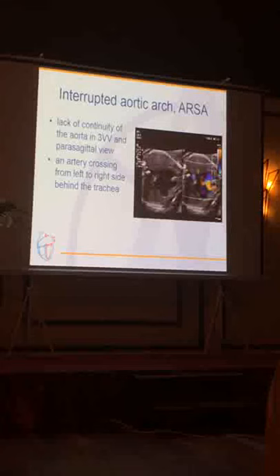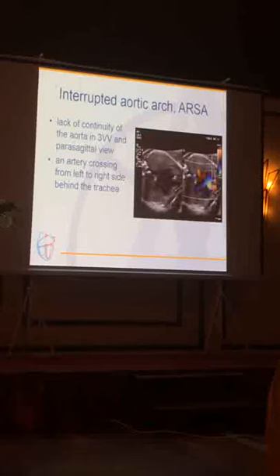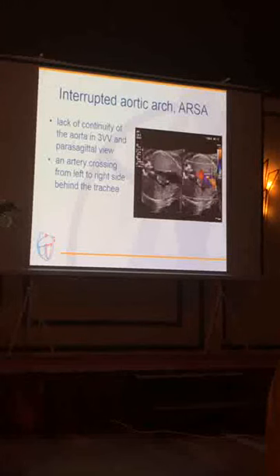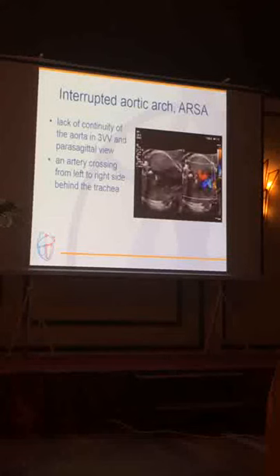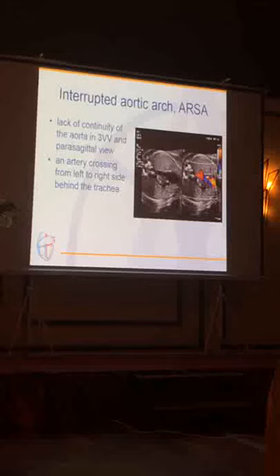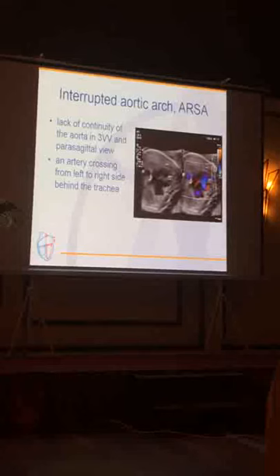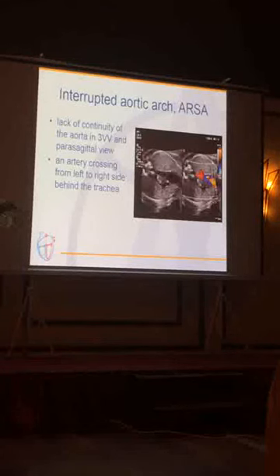So what is special about this defect that you can see in this image? Shunting, yeah? This is unidirectional shunting left to right, and it is quite unusual for fetal scans. So it's very suggestive of some aortic arch problems.